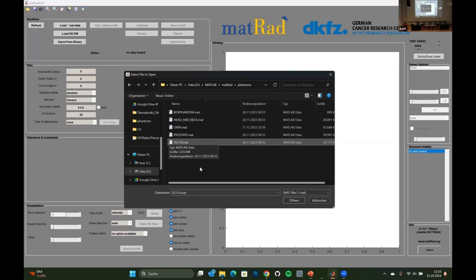It's a typical commissioning phantom from the AAPM task report, task group 119, which for IMRT created these C-shaped phantoms where you have a C-shaped target, because that's a standard thing that you can only do with this intensity modulation beam approach and not with the conformal approach.